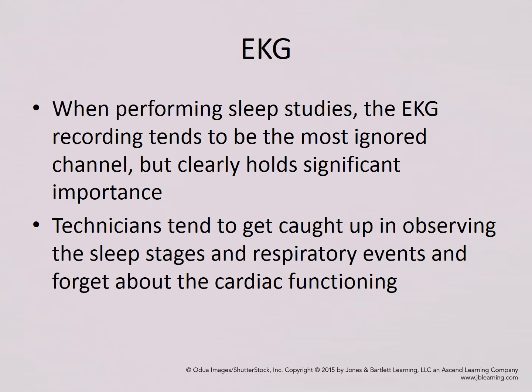In those situations, you want to document that you found them. You can document what epoch you saw them on, and if they occurred throughout the night or only at one time. Also, document if you recognize that they continue to occur along with some other event, like an apnea or something.